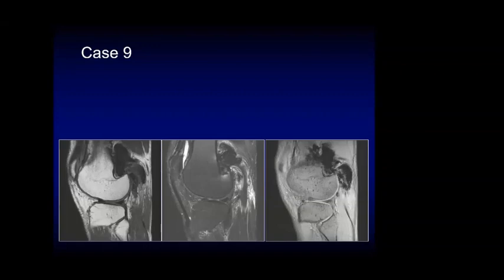Multiple section MRI, sagittal T2 with fat suppression, and another section is T2 fat suppression, showing a fluid signal intensity superiorly to the patella, the suprapatellar aspect. Posterior to the femur there is a well-defined lesion which is a hypointense signal intensity lobulated lesion.